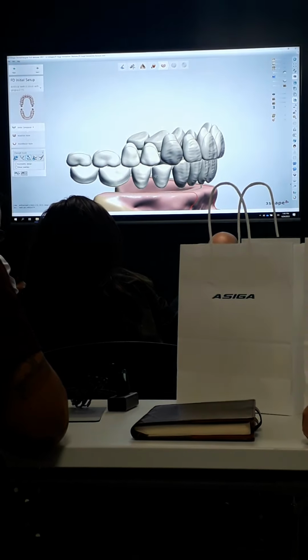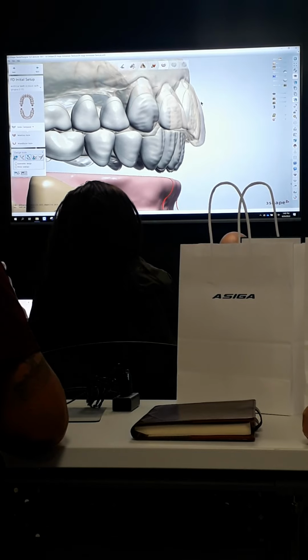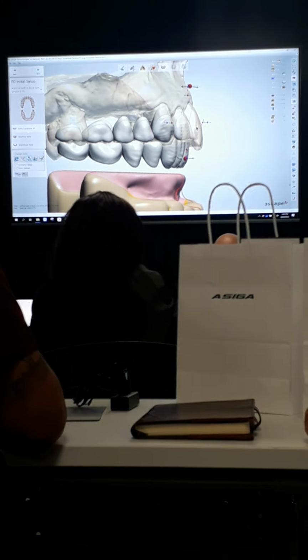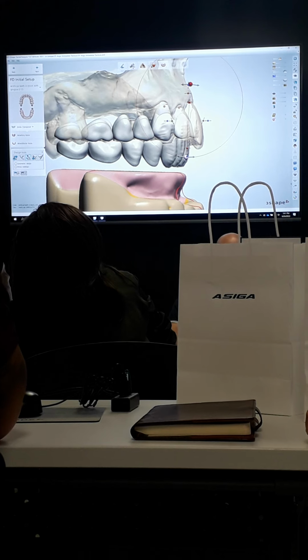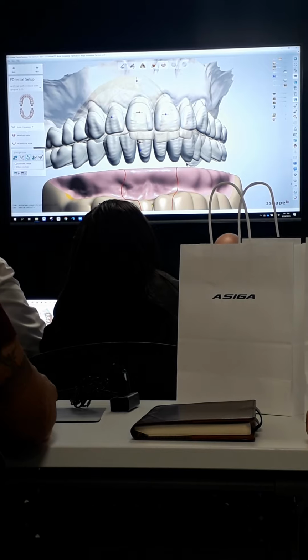The other thing I can do with this tool is with the anterior. If I look at it from a side view like this, and look at my previous, I can see that my uppers right now on my setup are a little retroclined from the position of my previous teeth. So let's say I wanted to match that. If I left click on one of my anterior teeth, I can get these control points here. The red and the blue small ones do what you would think. They rotate and move that single tooth. But the large red control points do something a little different. If I grab from this one, this is going to move the incisal edges of the uppers out, so I'm able to tilt those outward. If I grab from this one, this will work the necks of the teeth. And it's doing all 6 of the anterior teeth at one time, so I don't have to individually move those. So now I've just really quickly repositioned those to where I want them.